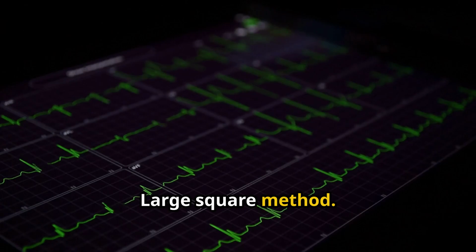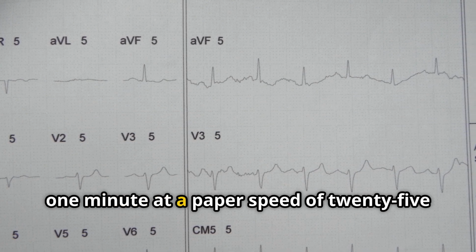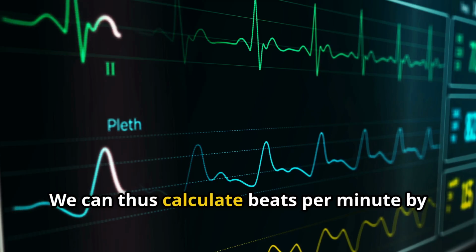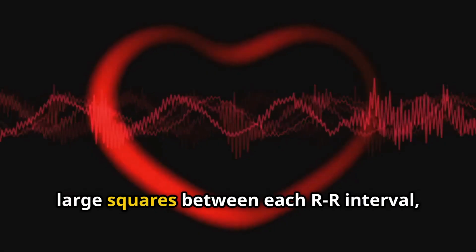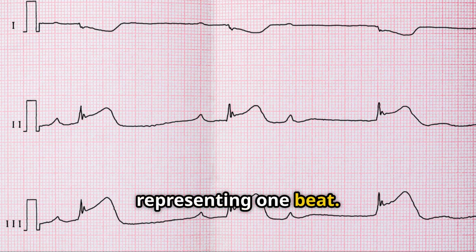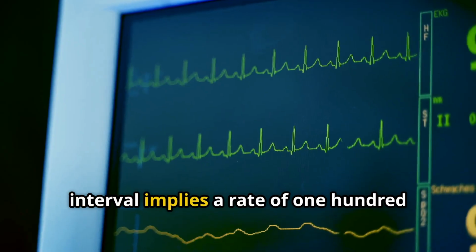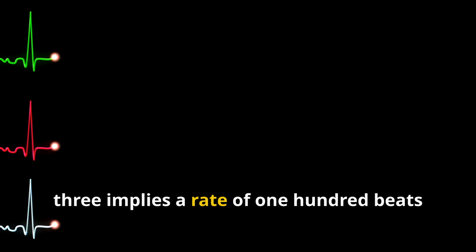Large square method. 300 large squares is equal to 1 minute at a paper speed of 25 millimeters per second. We can thus calculate beats per minute by dividing 300 by the number of large squares between each RR interval, which is the space between two consecutive R waves representing one beat. For example, 2 large squares between each RR interval implies a rate of 150 beats per minute. 3 implies a rate of 100 beats per minute, and so forth.